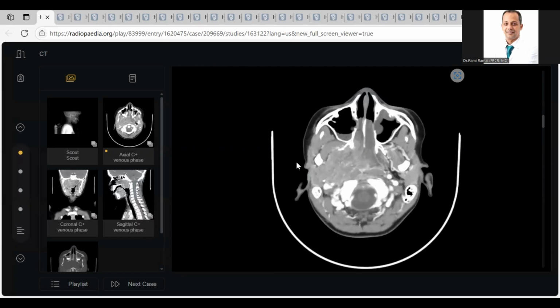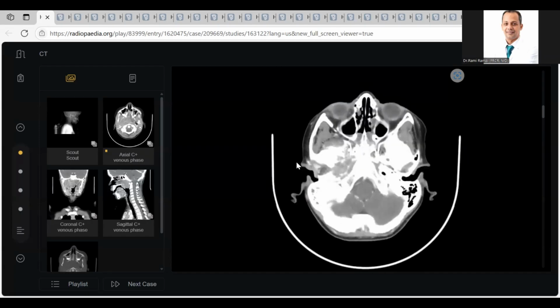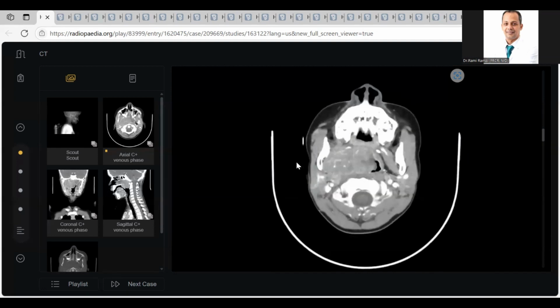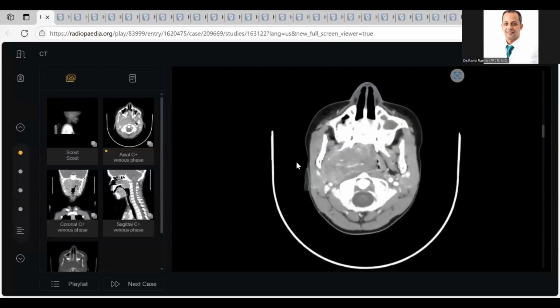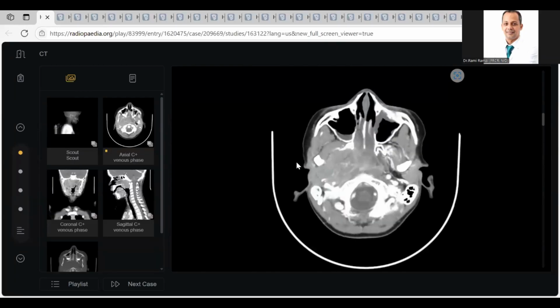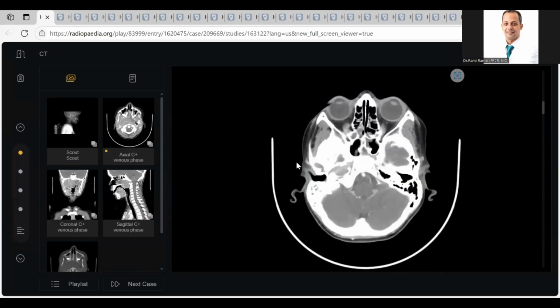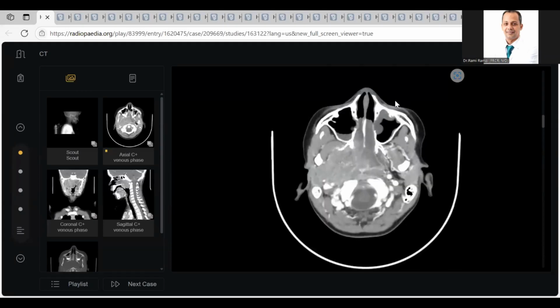What are other differential diagnoses? Sir, in an 8-year-old, it could be tonsillitis with tonsillar abscesses or a pharyngeal abscess. Okay, what else? Would an abscess or tonsillitis remodel the bone and make these bony changes? No, sir, very unlikely. So what is your other differential?